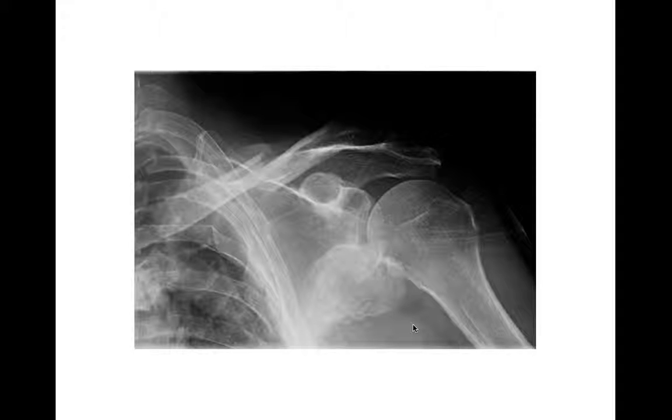Okay, just strange lesions of the scapula. Here we see this sclerotic lesion arising from the scapula right here. This one turned out to be an osteosarcoma, which is a strange place for an osteosarcoma, but they can occur there. This fracture was incidental.